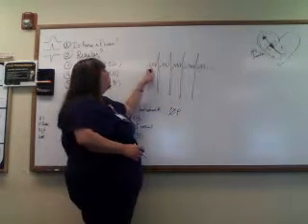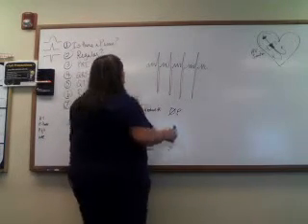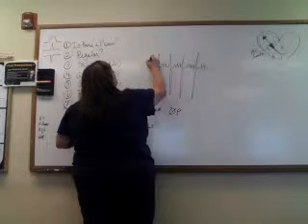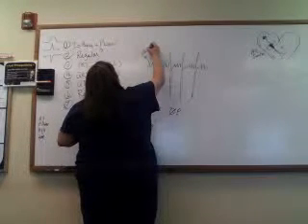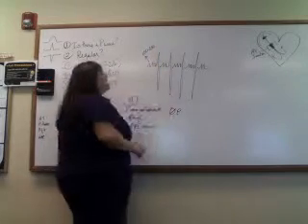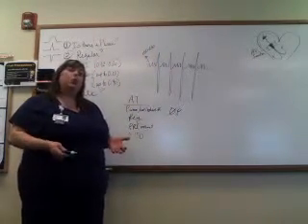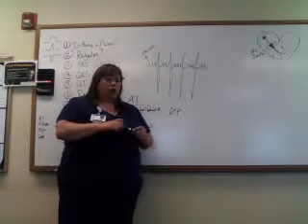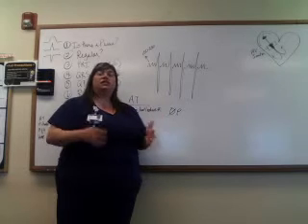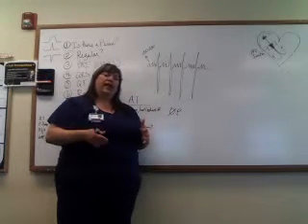Now, with this one, regularity, we can walk this out, but there's a better way to look at this one. So what is happening is the little safety net, because these have speeded up, these waves are happening at 150 to 250 per minute, okay? And that's too fast. So why is going too fast a problem for the heart? So what is the heart's focus? The heart's focus is to push blood around the body. So in order for it to do that, it has to fill.